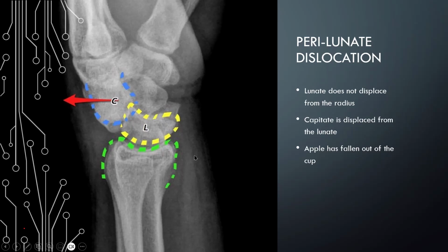If you look at the soft tissue over here, the soft tissue is quite swollen. So these capitate injuries, because they're so commonly missed, patients will go home, they'll sit with it. It's painful. They don't know what to do. They can't move their wrist properly. They'll often attend once, twice, three times until somebody decides to actually send them for a CT or an MRI where it's easily picked up, or they have a radiologist look at the X-ray. And it's such an easy thing to pick up once you know what to look for.